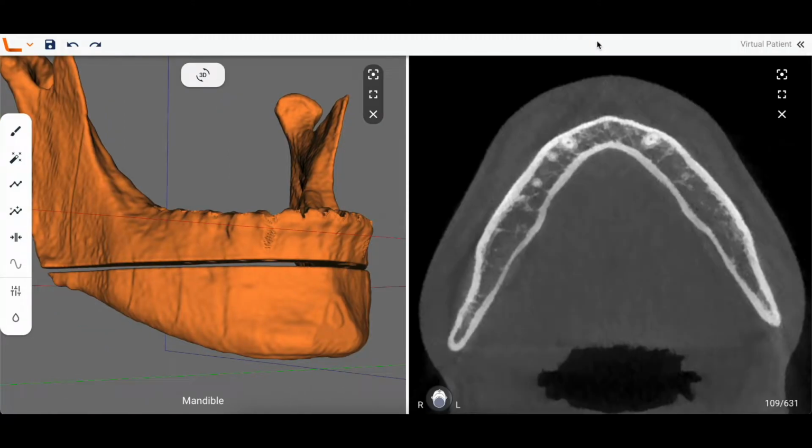Let's close the sidebar and have a look at the toolbar. The Livewire tool is a 4 tool in the toolbar and can be selected by clicking on it or by using the 4 key on your keyboard in order to toggle it on or off.